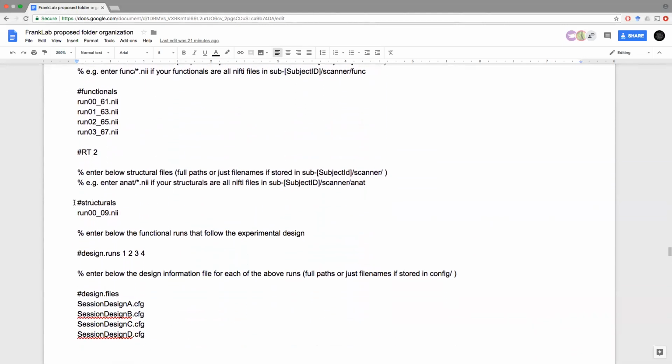Yep. Yes. Okay. So this is basically where you specify the source of the structural data, you just point here to the T1 MGZ file that is the output of FreeSurfer. We haven't yet come up with the best way, with a recommendation to do here. And Jason, I wanted basically your input on this. What do you think is best?